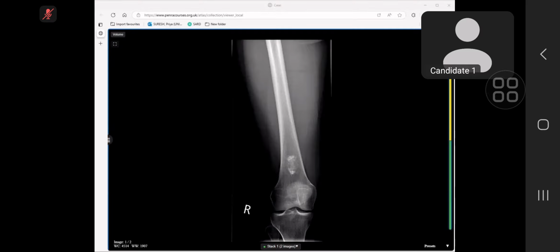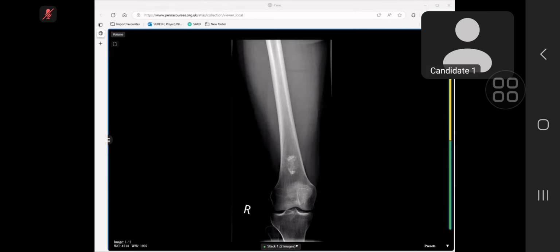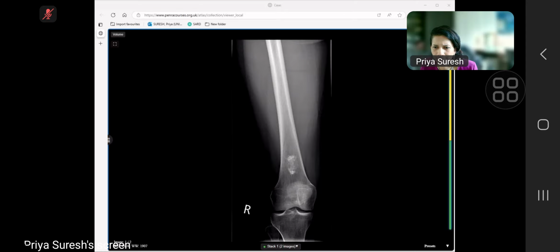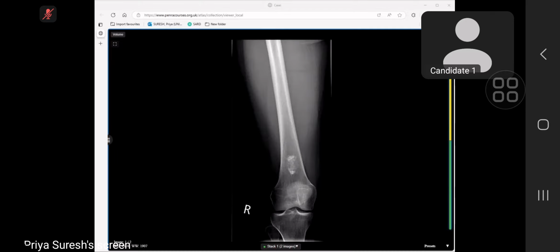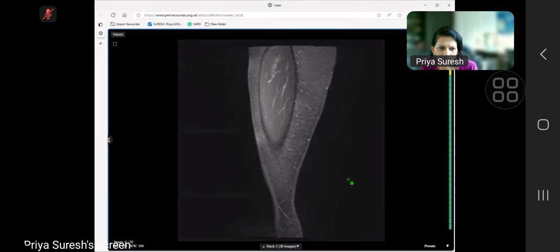I would like to compare this radiograph with any prior, if available. This lesion does not appear destructive, keeping in mind the history of carcinoma, so it's likely an enchondroma. I would further confirm on MRI, including post-contrast images. There are no previous radiographs available.